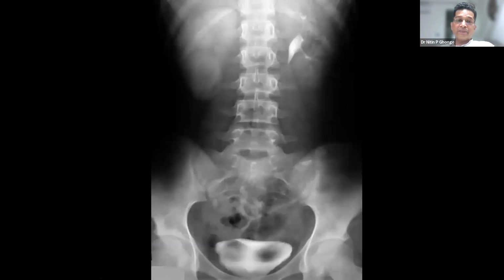This is an example of again the normal left kidney, the dense persistent nephrogram on the right kidney, which suggests that there is possibly a stone in the ureter, distal obstruction is there, and we can track the course of the ureter.